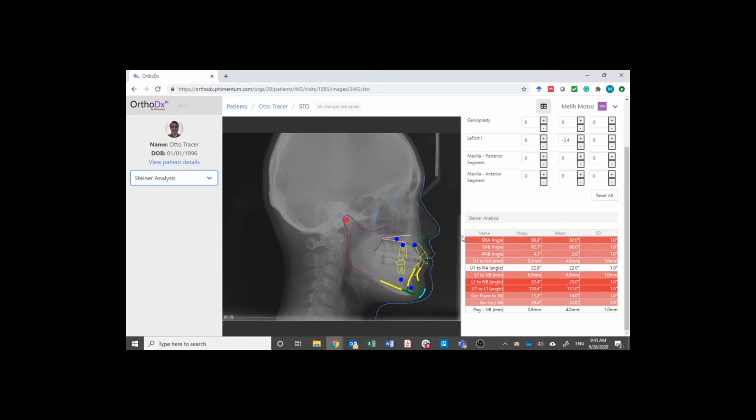So your new measurements will be appearing on the first column represented by the heading of measurements, and it will show you what will happen to the measurements when you make the necessary changes on your planning, depending on the estimated means and standard deviations.